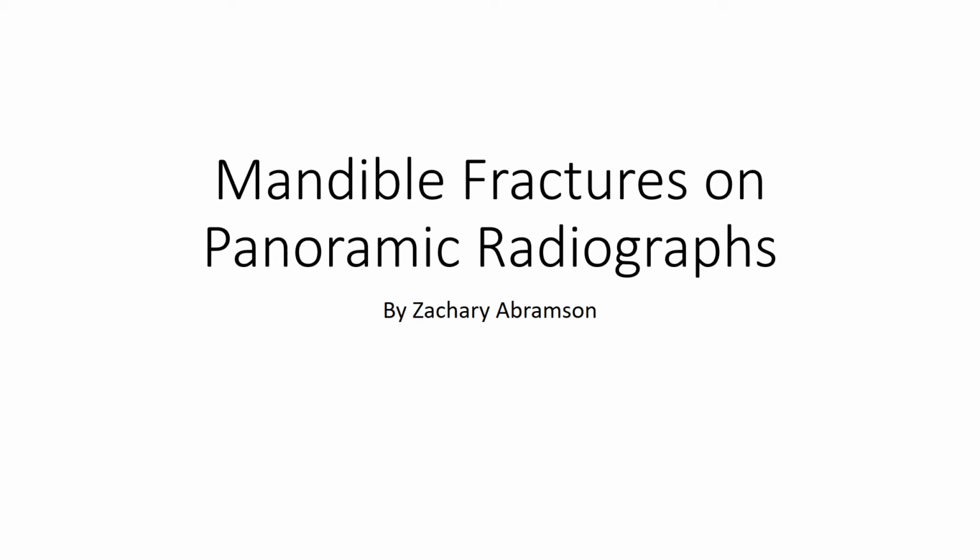This is a short talk on the interpretation of panoramic radiographs in the setting of suspected mandibular fracture. At academic centers with oral and maxillofacial surgery departments, it's not uncommon for the panoramic radiograph to be the only study ordered in lieu of a facial CT.